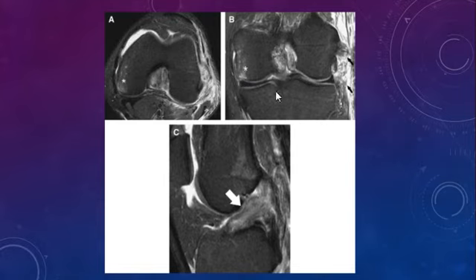You can obviously see here, this is the fibular collateral. This is the site of impaction at the medial aspect, while at the lateral aspect is the site of rupture of the ligament, the fibular or lateral collateral ligament injury. In this case, the ACL was also torn, you can see here. Okay, so you have bone marrow edema at the medial aspect, and you have ligamentous rupture at the lateral aspect.